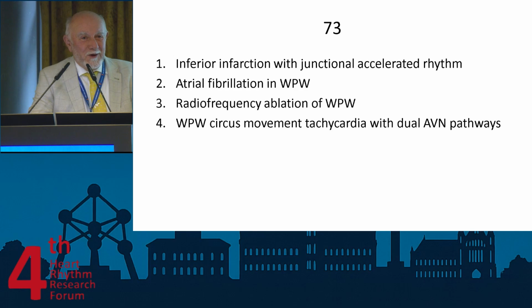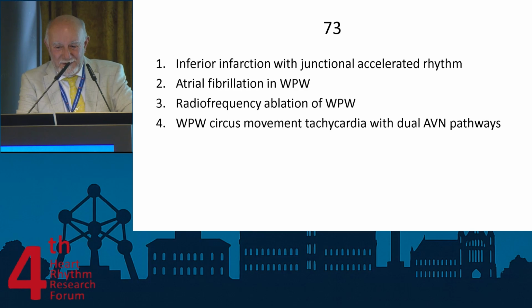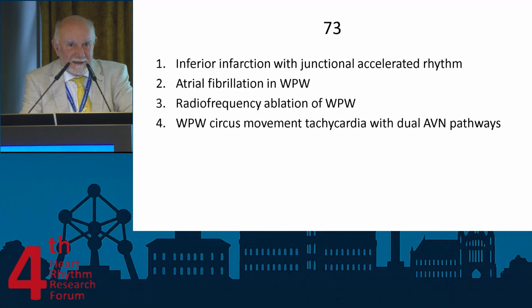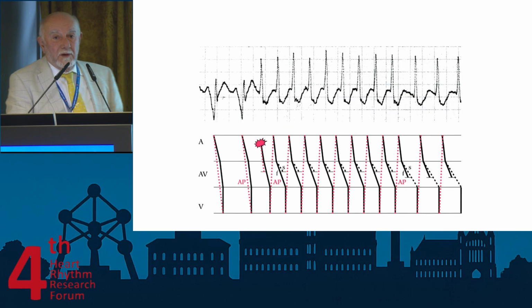No? Who votes for one? Nobody. 2? Atrial fibrillation is not, of course. Radiofrequency ablation, I'm not going to show you that, and you would see probably the artifacts, of course. So indeed, circus movement tachycardia using an accessory pathway, okay, and dual AV nodal pathways.